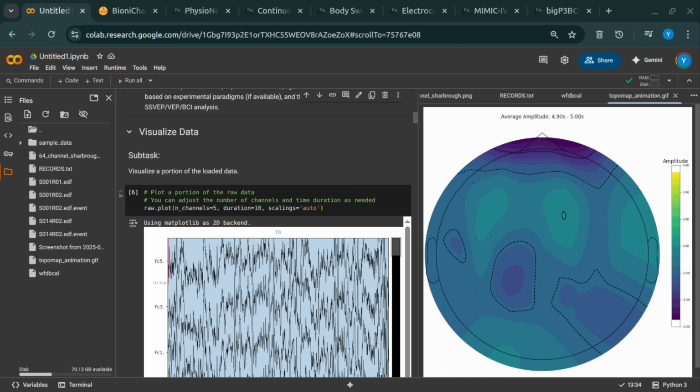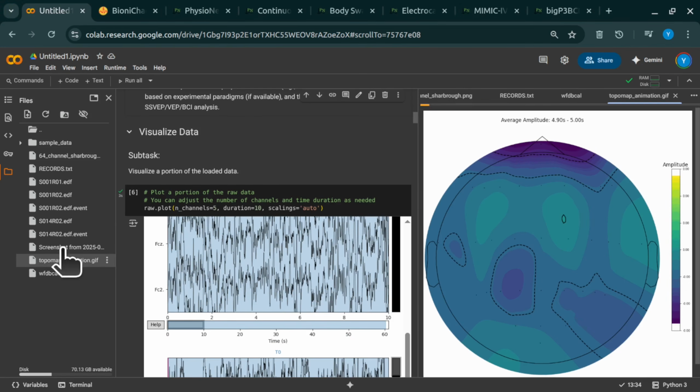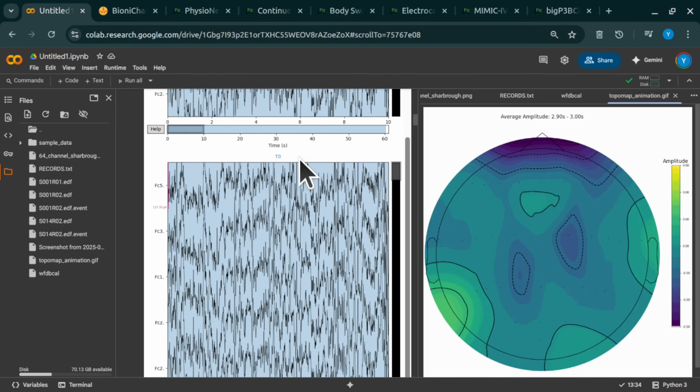A library, okay. And within that library, we zoomed in on one specific file, S001R01.edf. This file is just one recording from one person doing a specific task involving moving and imagining movement. A really good place to start. Gotcha. So how did you actually get your hands on it?